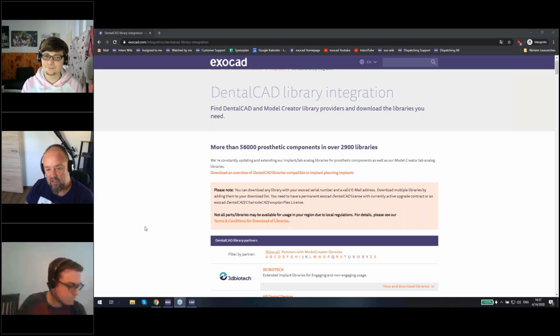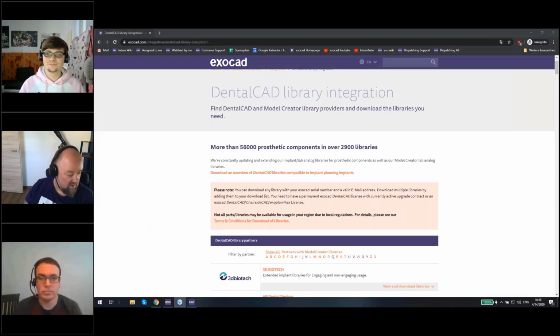If you'd like to have additional tools libraries, there's an add-on module, the ZRS tools library add-on module, which can be activated on a dongle, and this will automatically download additional libraries to your software version. Maybe you show it just, Friedemann, where to download this.